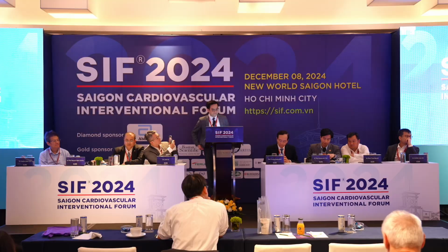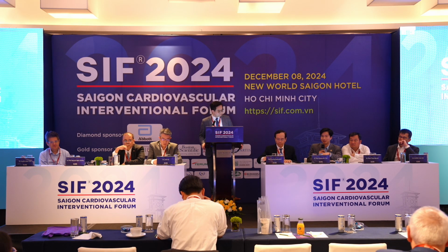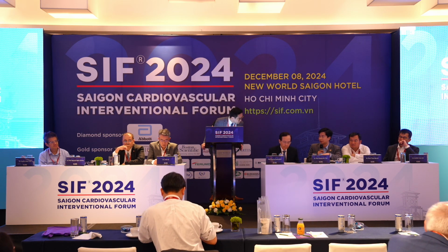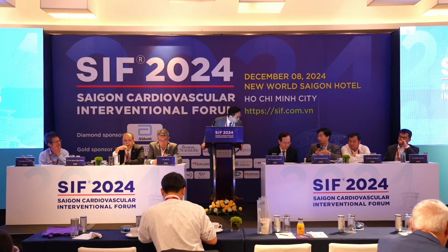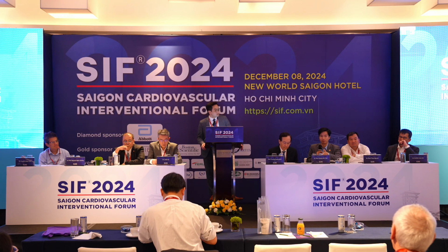Yes. And the second point is in the follow-up, where we chase the shadow of the disease. So what you should check, for example, is ACT. We should use very strong anticoagulation, for example, maybe thrombolytic or some heparin, to prevent further thrombosis in all the arteries. Yes, I think it's very important, and we can mention it in the clinical setting.